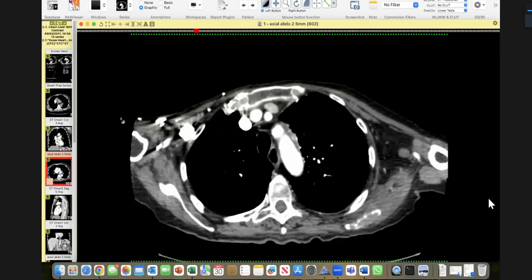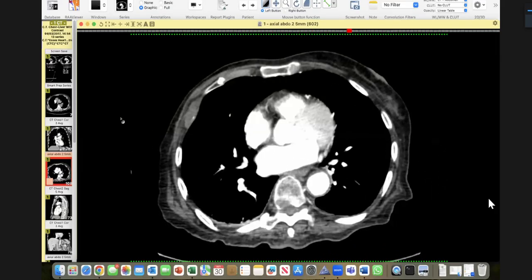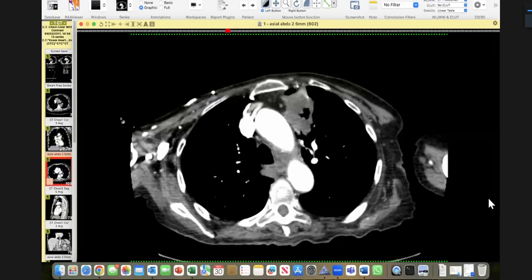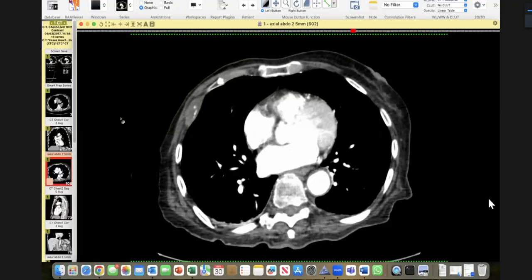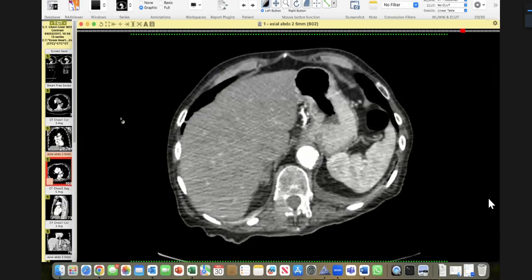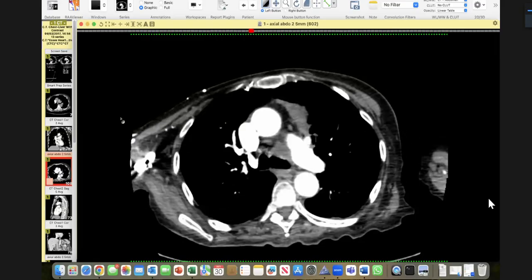However, on this mediastinal window, I have just noticed that there is, for example, an osteolytic lesion epicentered on this right rib. I would have counted it, but for the time. So this is likely metastatic bronchogenic carcinoma, and I will describe this to the referring team, and this case will be discussed at the MDT. The next step will be bronchoscopy for histopathological confirmation, and then the staging, to be treated.